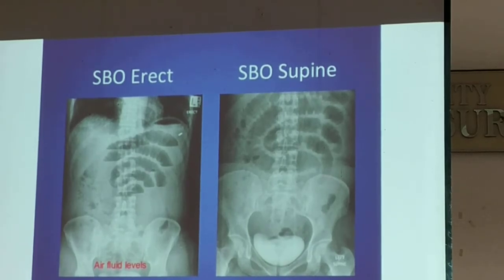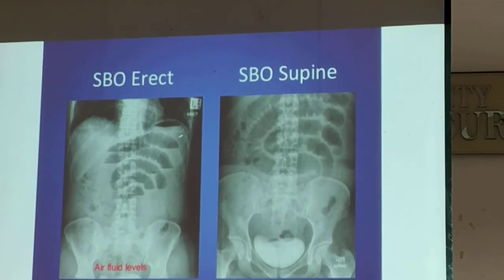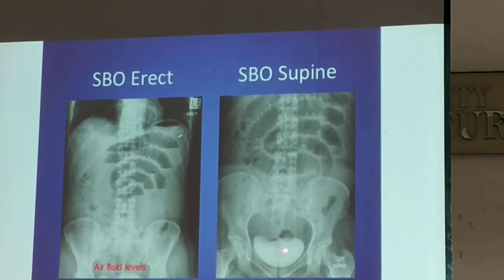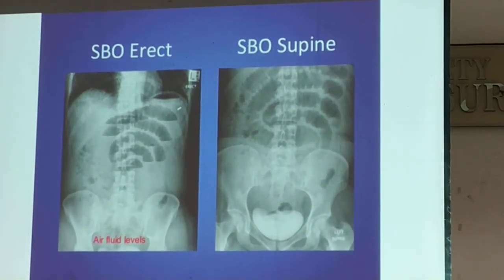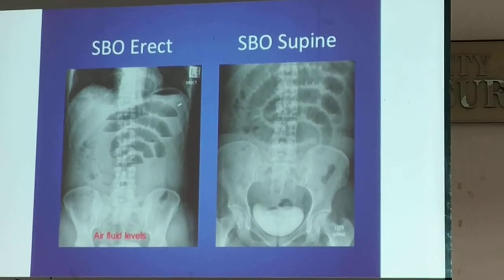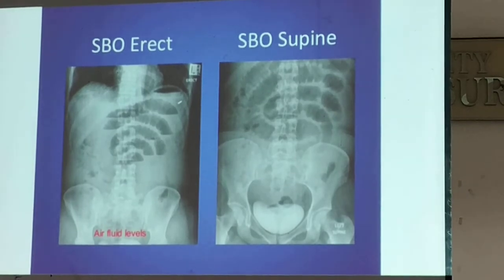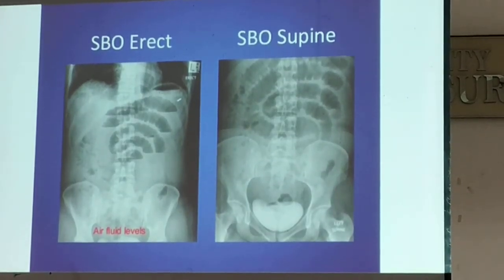So the contrast material is mixed with your urine. So the white one is the bladder area. And within the bladder, urine is being contained within your urinary bladder. Okay? So with the last film, usually, we would request the post-void film.